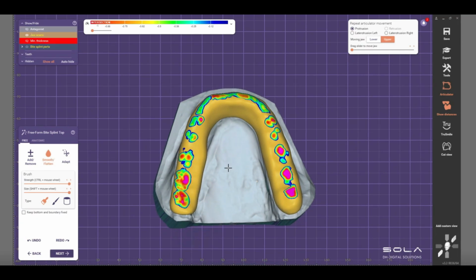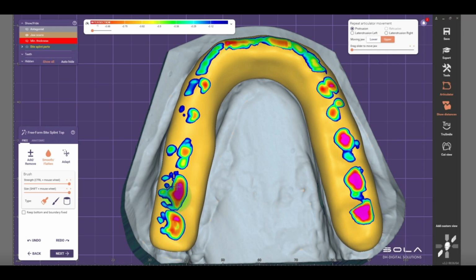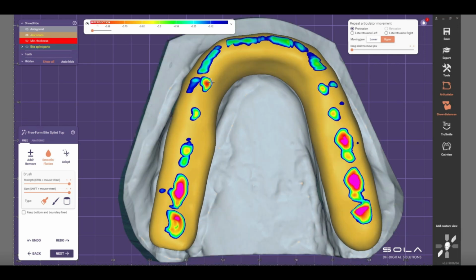And then I would smooth it out right on the top, so it's in that area of blue and magenta. I'll smooth it out here. So I need to get into that area, roughly into that area.